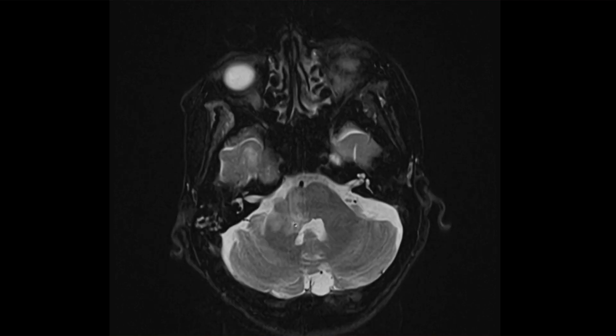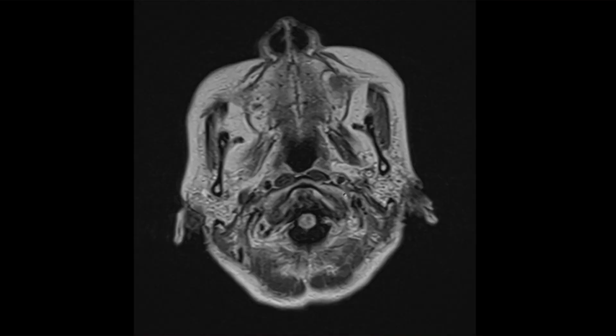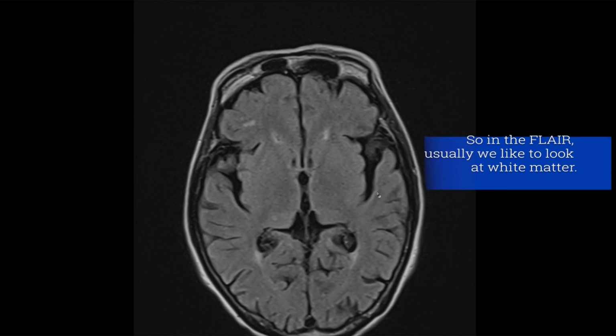And we'll talk a little bit more. There's some bright stuff here. This is actually tumor, but I'll talk about this a little bit more on the FLAIR next. So here's a FLAIR.